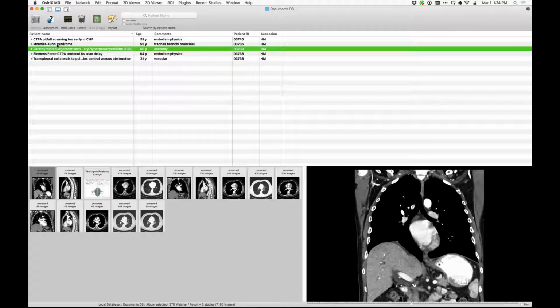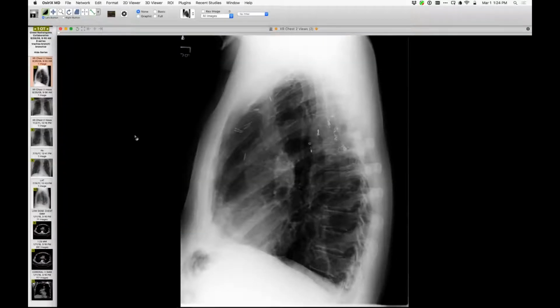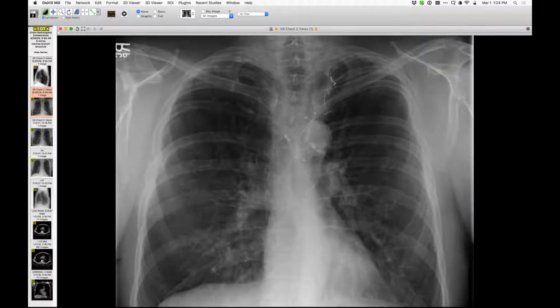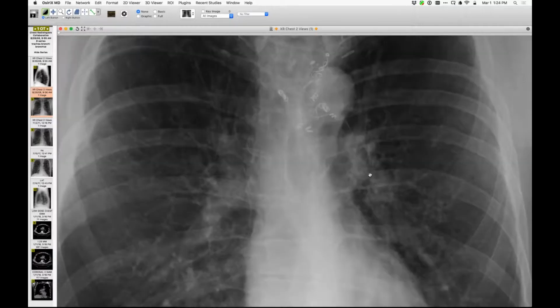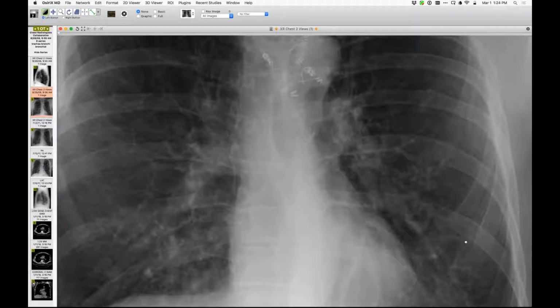All right. Just a quick case of something we've all seen before, and that is this here. So the tip-off over here, this is actually a bit hard because the history was initially confusing, but you can see he's had embolization procedures, presumably for hemoptysis. I wasn't really sure of the history. But then on conventional chest radiography, if you're lucky enough and you see these cystic structures here, you can see round, thin-walled cystic structures in both lungs.